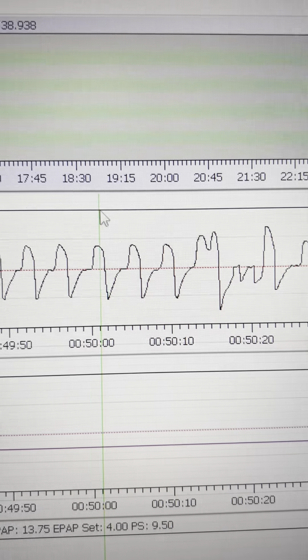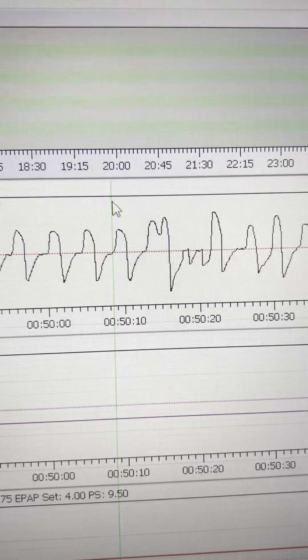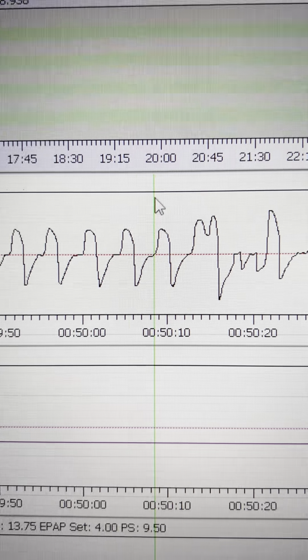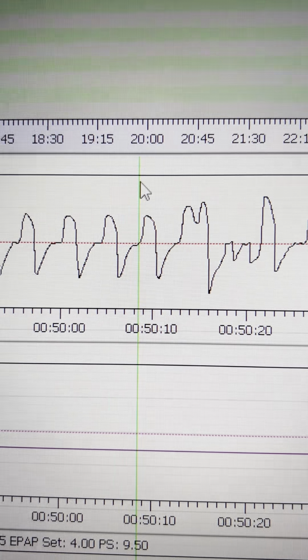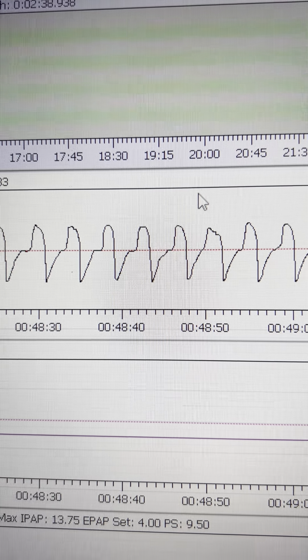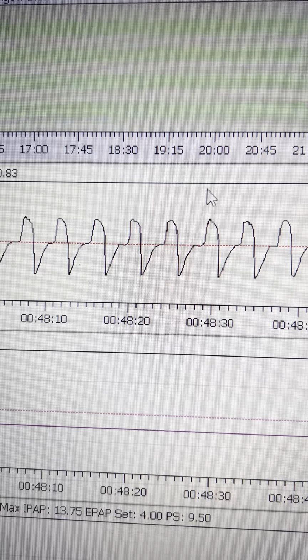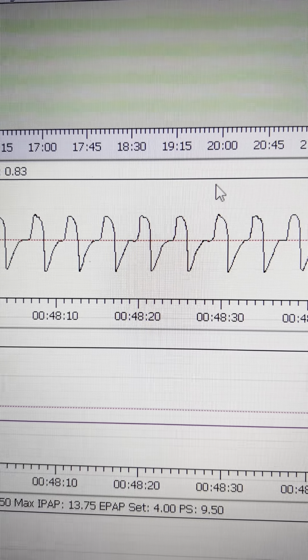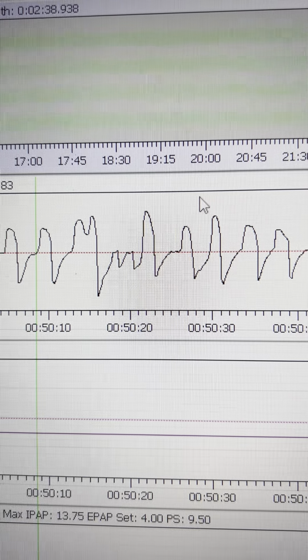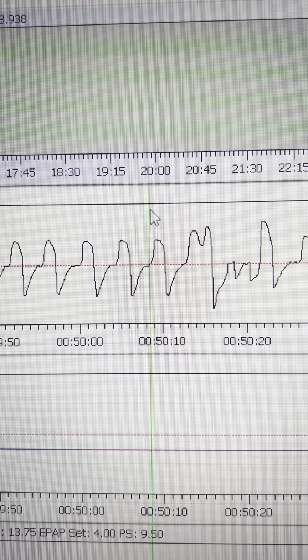Here I have a recovery breath, which is bad. These ones you would actually want to lessen as much as possible. So what happens here probably is, when you see this, why am I having it? I have normal breathing here. No, I didn't. Every breath right here probably stacked up and I couldn't get more oxygen to stabilize it. So what happened was, boom, I got a recovery breath here.